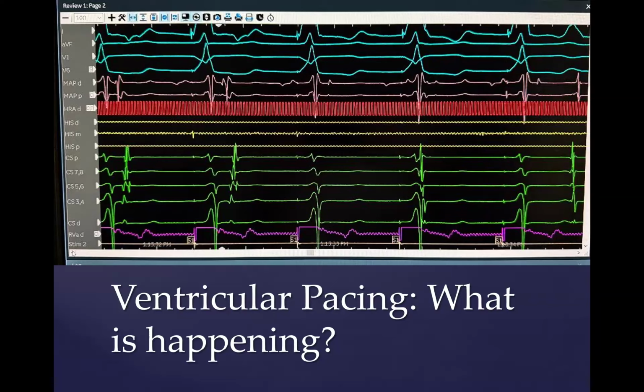In other words, you may injure it just enough that during the time that the patient is on the table, there is no VA conduction through the accessory pathway. So if you see this, and RF current was being delivered at the moment that this happened, that would be a good sign. That would mean that we burned the pathway. But if RF current was not being delivered and we were just moving the catheter around and mapping, then that's not so good because it means that we've inadvertently injured the pathway without a burn. Now you might say, oh, but the pathway is not conducting.